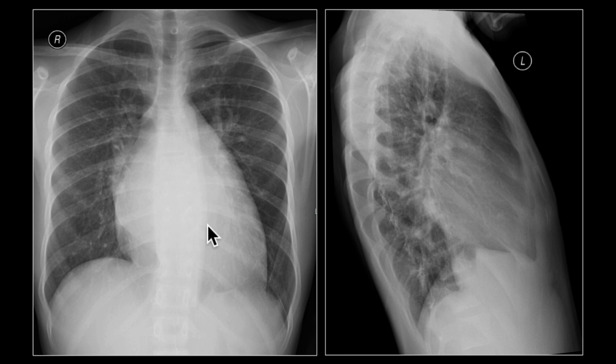Now, another thing that happens with left atrial dilatation is that the appendage, which should have a normal appearance that's either straight or concave inwards, would give you more straightening or convexity outwards if it's enlarged. So, dilatation of the left atrial appendage in this location here.